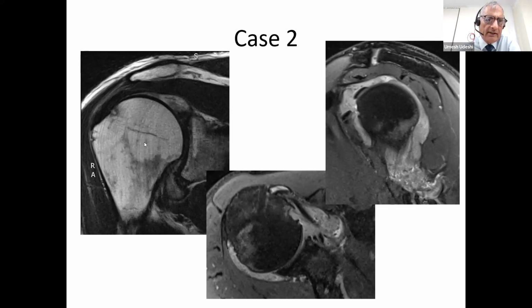What should it be normally? Well, on plain X-rays, we would expect it to be 9 to 12 millimeters. On MRI, in patients with shoulder pain, it's rarely that. But if it was anything below 5 or 5-ish, then I would call it reduced. And you can see that the fat stripe is effaced. It's up to here, and then you don't see it. So there's definitely impingement.